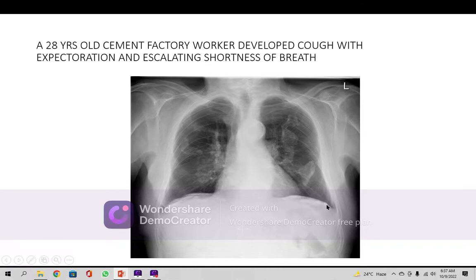Plus, at the dome of the diaphragm you see these linear striations, which are hyperdense shadows here and here, obscuring the curvature of the lungs. As far as the middle mediastinum is concerned, the left and right heart borders are not obscured completely by these thick fibrous bands. And there is hypertransparency inside, meaning compensatory emphysema is there. The aortic knuckle is more prominent in this age group.